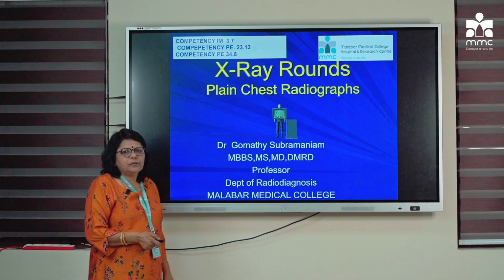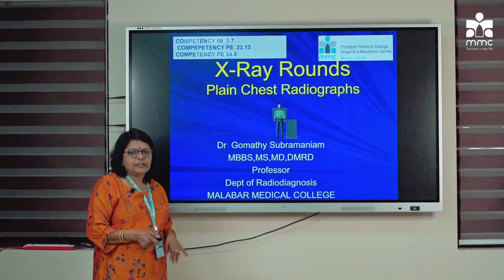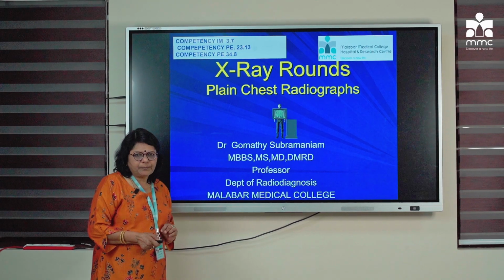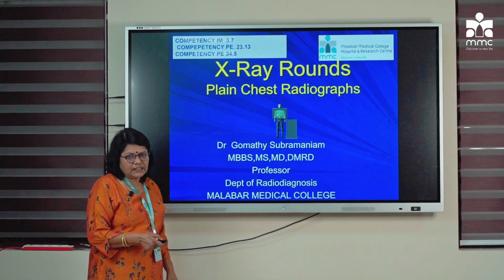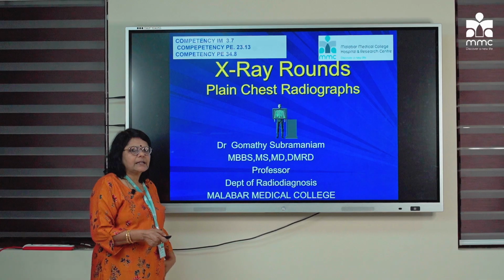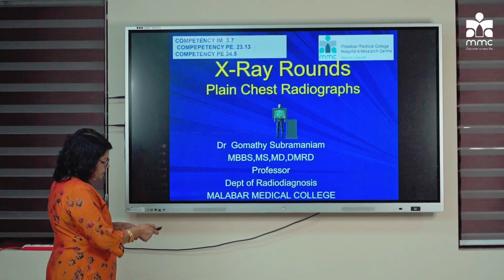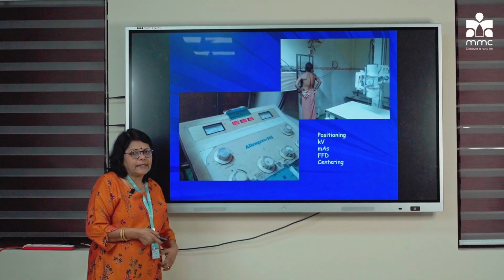Today I am going to tell you a few things which are very important for all the residents, the junior faculties and other faculties: how to interpret a chest X-ray, which is very important because that is the basic investigation for all the patients coming to the department with any clinical scenario. So, as you all know, how do we take a chest X-ray?